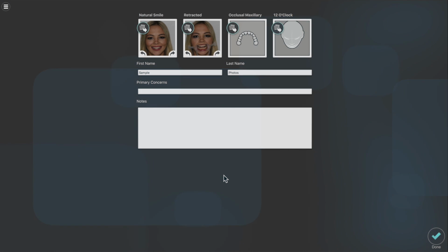In this video we're going to walk through the design of our sample case step by step, and we're going to create our treatment plan and the before and after simulation for this case. So let's get started.